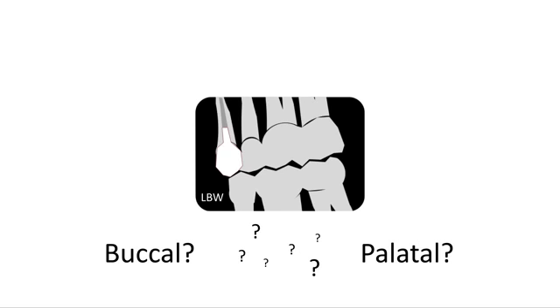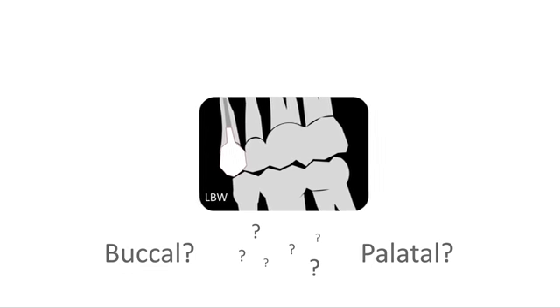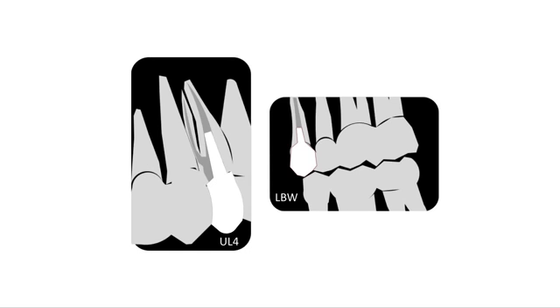In order to visualize the roots clearly, two radiographs are taken at oblique angles. So the vertical position is fixed and the tube is moved horizontally to create image number 2. The horizontal tube shift will cause the overlapped roots to move apart, as you can see in the periapical image. SLOB stands for same lingual, opposite buccal.